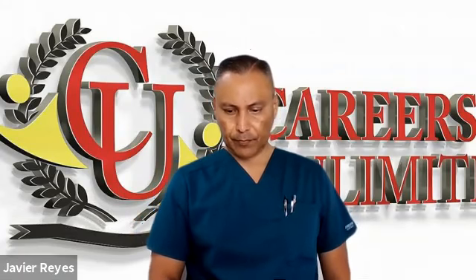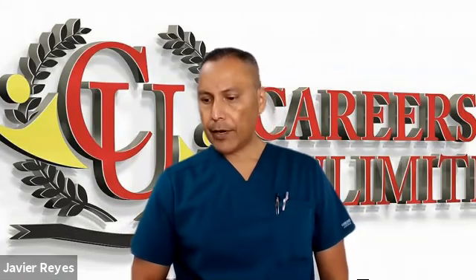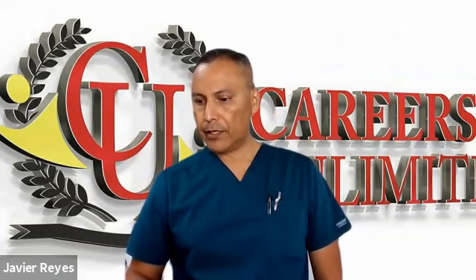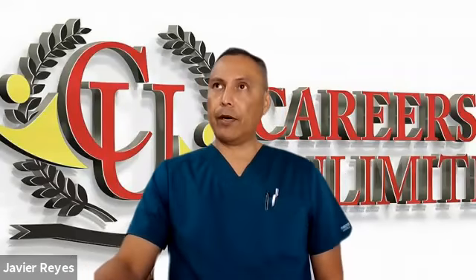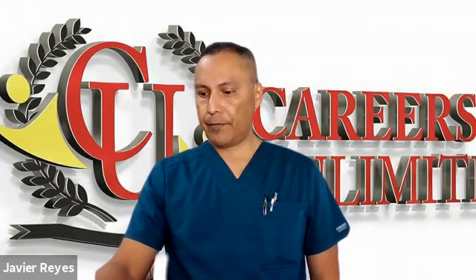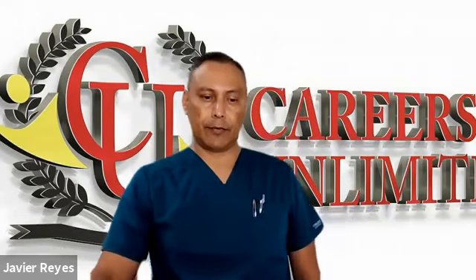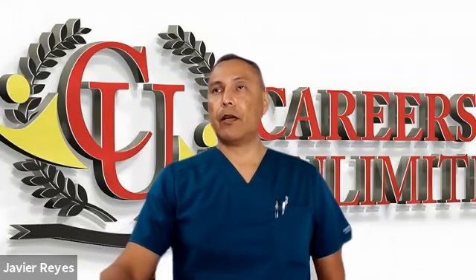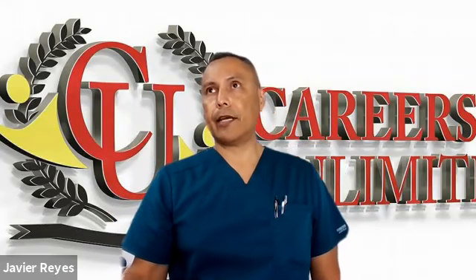So let's look at checkpoint questions. 10.2, letter A. What do we see in letter A? What kind of wave are you looking at? A QS, right? So it's going down. So that means this would be a left or right bundle branch. If you said left bundle branch, you'd be correct. Remember, the left bundle branches are characterized by a downward, or negative, QRS.